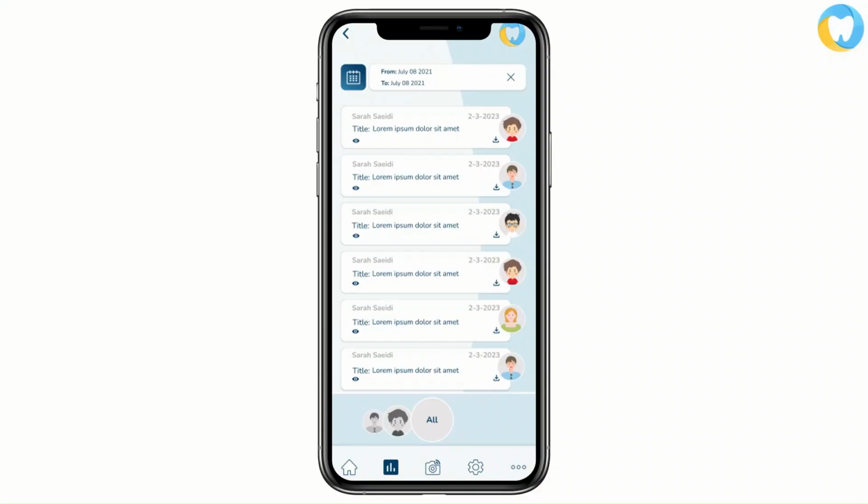As soon as your video is uploaded on our service, our artificial intelligence software will work on it, and it will analyze all abnormalities, and then it will let you know if there is anything, and you will be prepared for any early detections of any abnormalities, and then you can move forward to see your results and to choose whether to have professional consultations or to just send the video to your dentist.